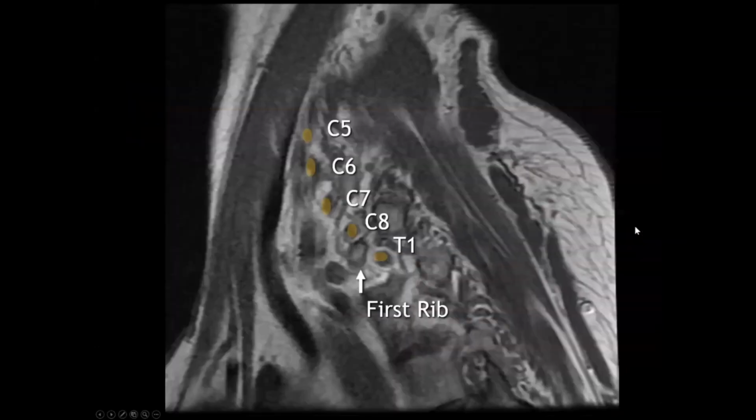So again, like I said, I like to look at the sagittal images most for identifying the individual components of those nerves. So I've labeled the 5 nerve roots. Using the first rib as your anatomic landmark is important. That helps you separate C8 from the T1 nerve root. And just be careful if you have a cervical rib that can throw off your count. So make sure that you look at the rest of the cervical spine or look at some x-rays.